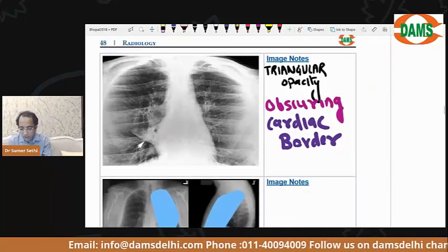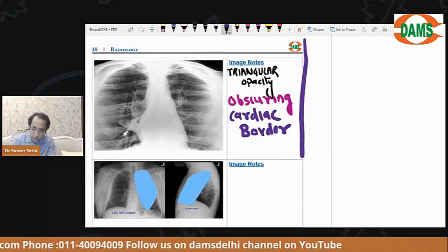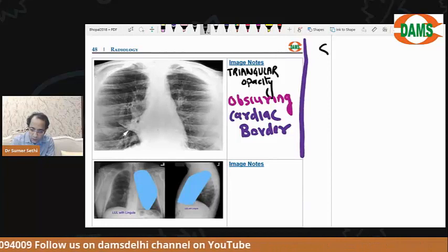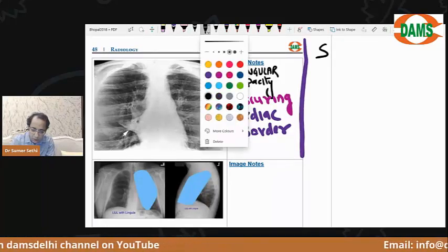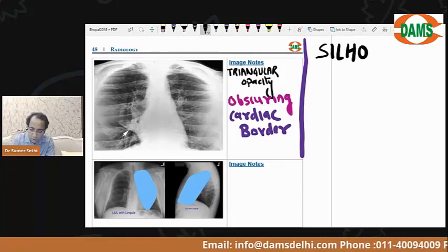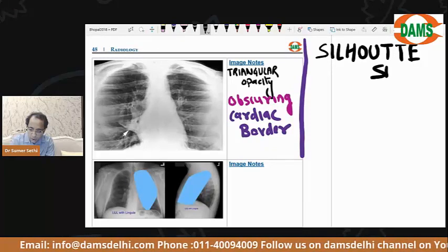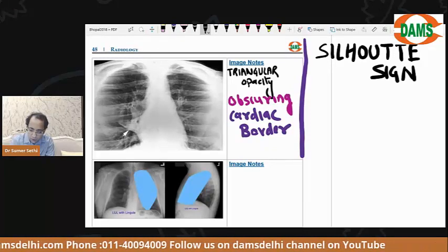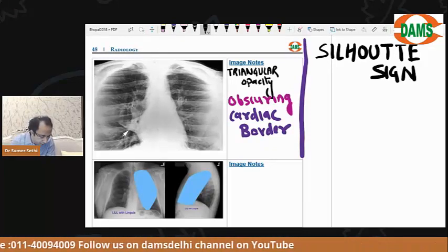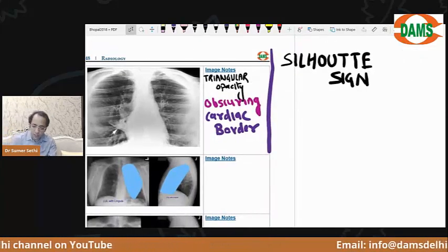Okay. Let's see if you can answer here or not. Have any of you ever heard a sign in your clinics or in your hospital, did they ever talk about the silhouette sign? Okay, so what does this mean? The silhouette sign means, let's understand it here and then I will apply it.